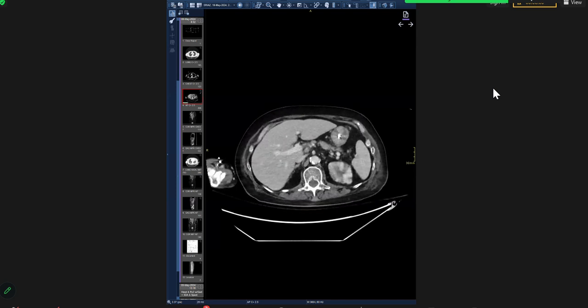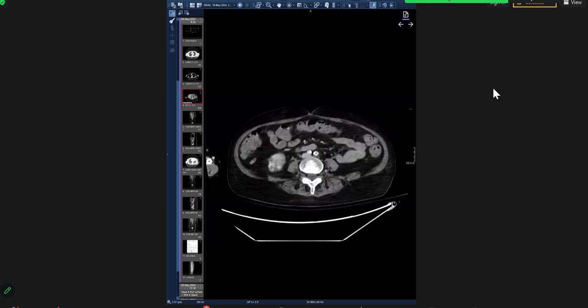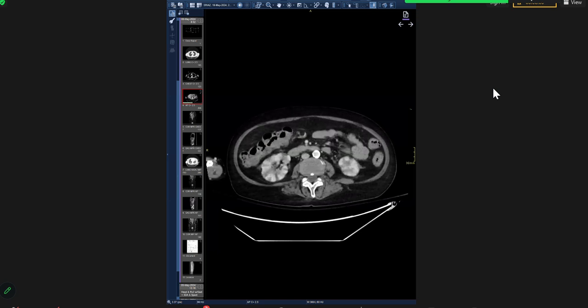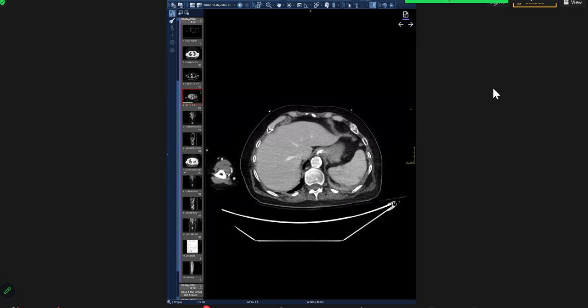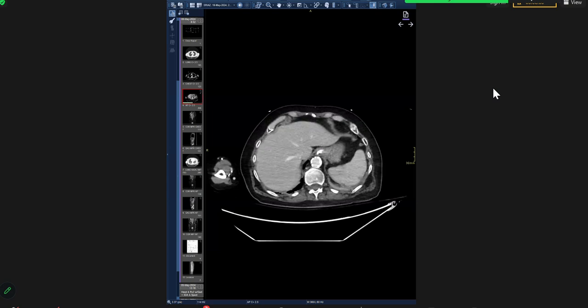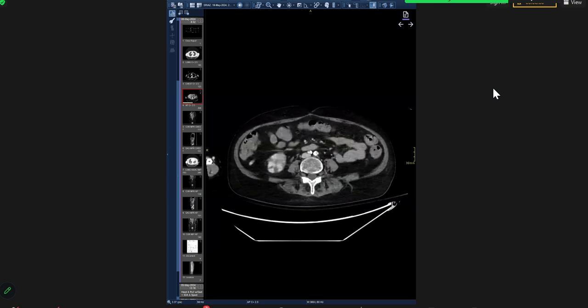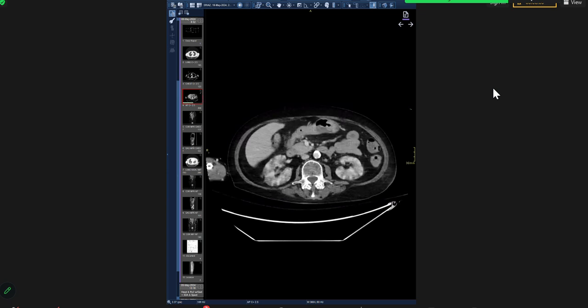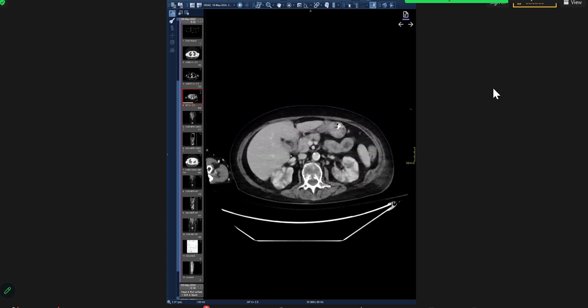These are the CT scan abdomen axial sections taken in the contrast enhanced phase of the same patient. In these images, I can see multifocal hypodense areas noted in the bilateral kidneys. A few hypodensities are also noted in the spleen. Significant atherosclerotic changes are noted in the aorta. So I'm suspecting there could be multiple infarcts.